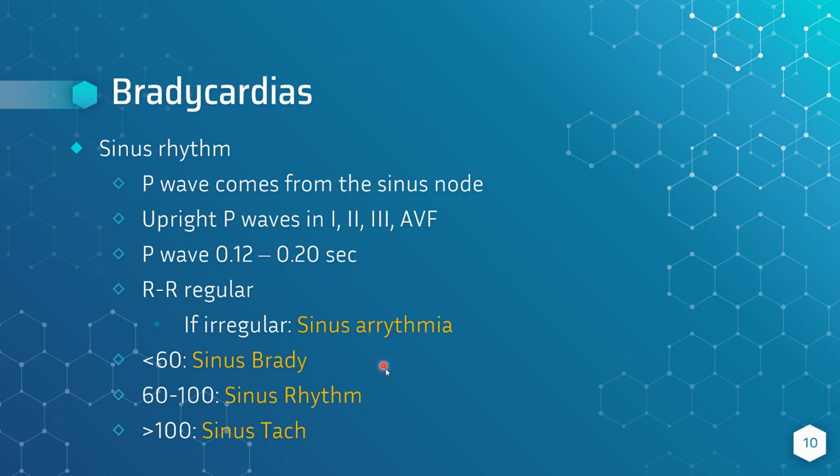And depending on the rate of the patient, then you get into more specifics. If it's less than 60 beats per minute, it'd be sinus brady. If it's greater than 100, then it'd be sinus tach.